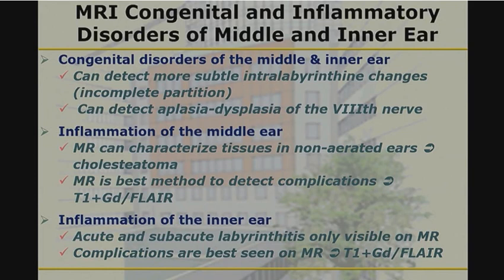And I've shown you today CISS imaging before and after contrast. We use this as well for looking at neurovascular compression. And you'll see, just as in the case of the second nerve deformed by the meningioma, you can see the cisternal segments of the fifth nerve, for instance, separate from the blood vessels and deformed by the blood vessels. And we think that that's helpful and more specific for the question that you asked.